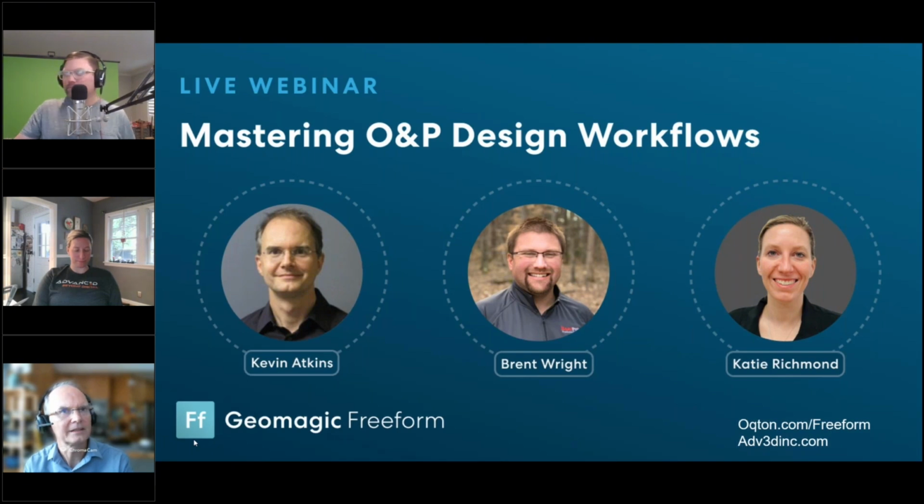Yeah, and it's not that we're necessarily different in Freeform, because global is global, and we respect the same global system that's in the CAD system and all general design systems. It's generally what we call Y up or Z up. A lot of mechanical CAD packages for some reason have Y as their vertical when you hit a standard front view, and then I think automotive tends to go to more Z up, but it just changes between different CAD systems.